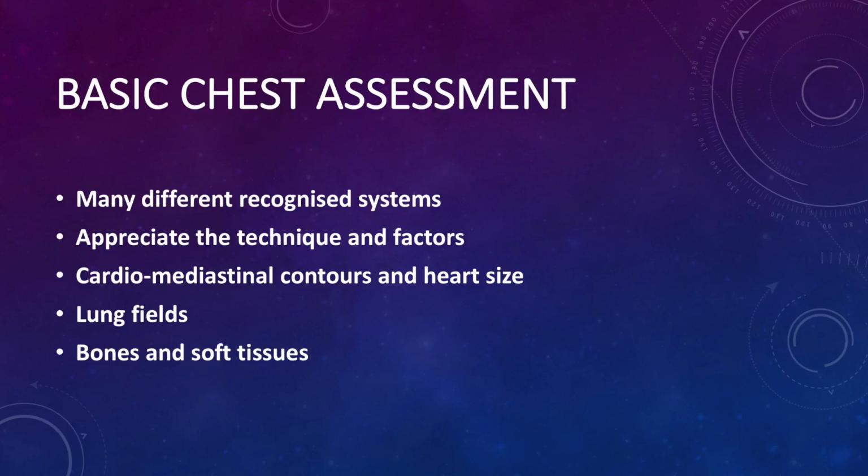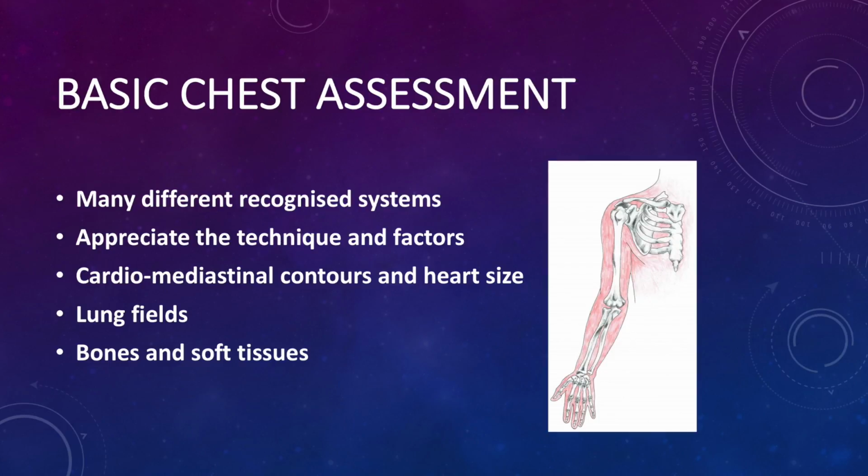As a chest reporter, I get asked to review films, and they're normally shoulder films, I would say, as a general rule. And in most cases it will be a prominent anterior first costal cartilage junction, which is very broad, very sclerotic, and it creates a sclerotic density in the apex of the lung. Most people look at that and think, oh, that looks a bit dodgy, I need to get some further assistance on that. So I normally get asked questions about that. I get asked questions about pleural thickening, and then people talking about rib anomalies, etc.